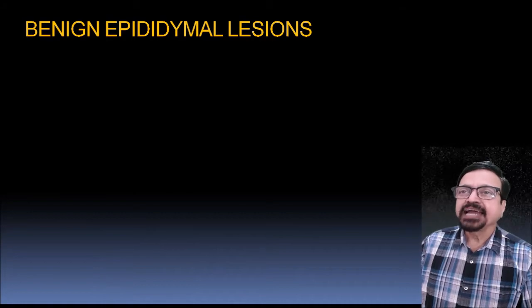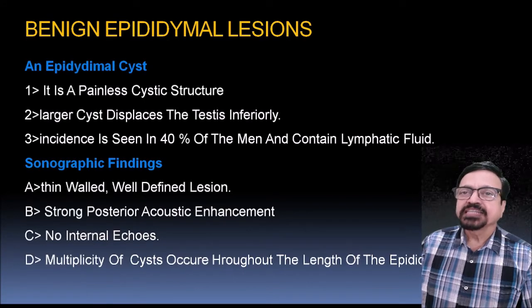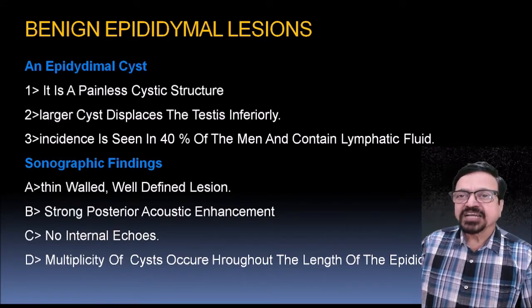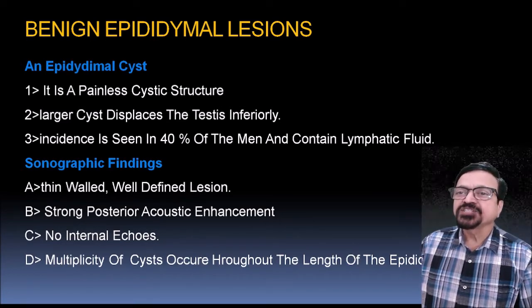Now benign epididymal lesions. The epididymal cyst is a painless cystic structure. A large cyst displaces the testis; the testis is displaced inferiorly by a large cyst. The incidence is seen in 40% of men, which is fairly high, and it contains lymphatic fluid.